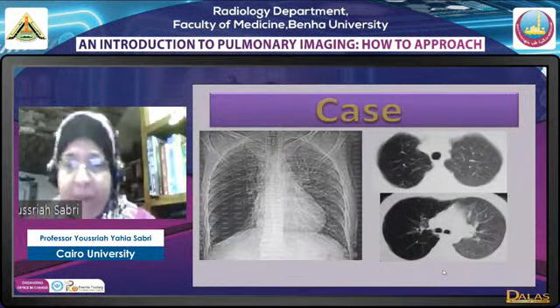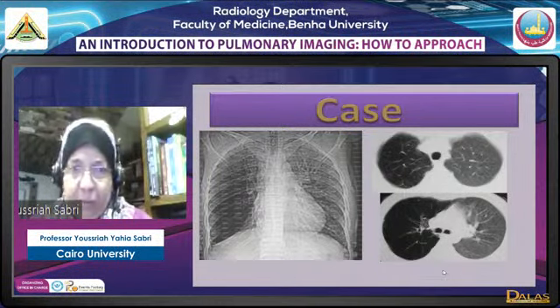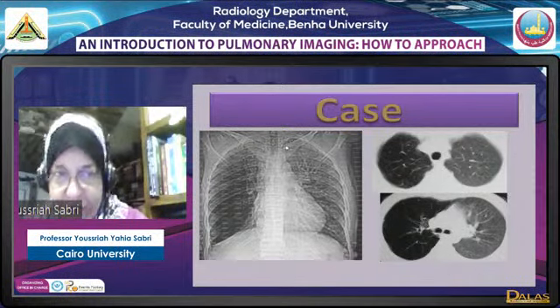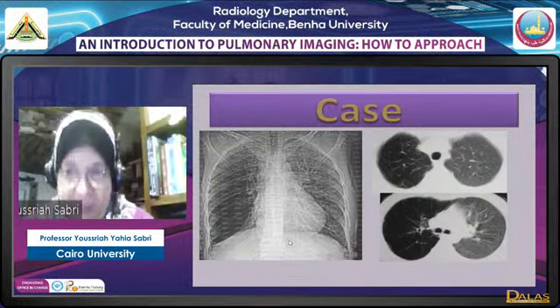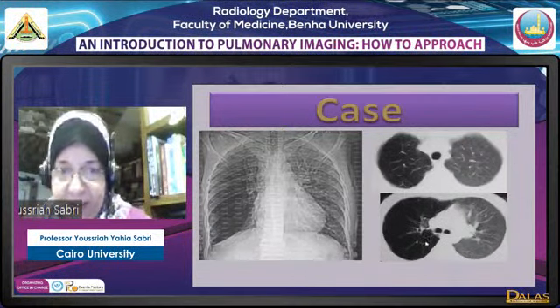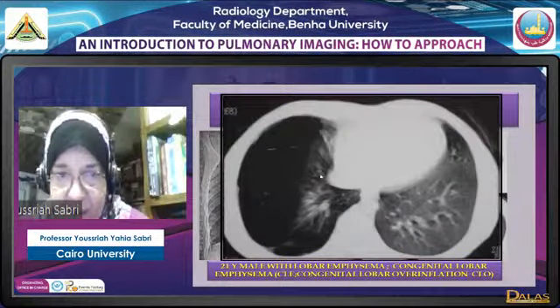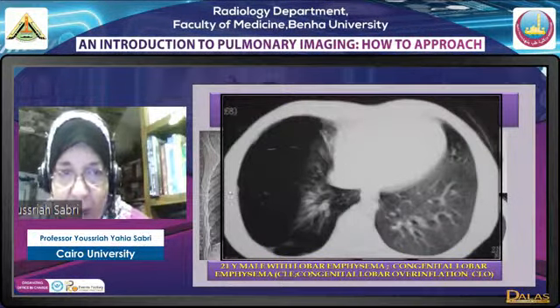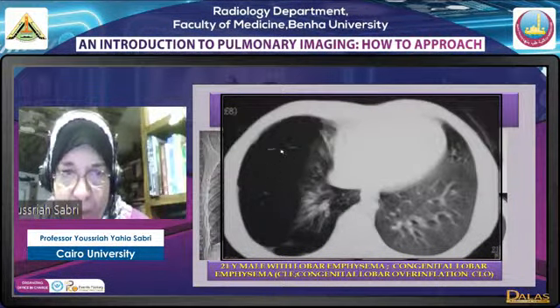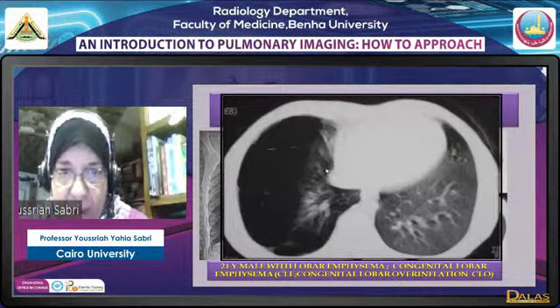Now we know that a big black lung means obstructive emphysema, but we need to understand why there is no shift of the mediastinum. Going to physics, if there is no shift, it may mean that there is something else balancing this mass effect. If we go to the next images, we find that there is still lung tissue here. So is it hyperlucent? This is not pneumothorax. We have lung parenchyma and vessels here, sparse but present, and we have this lung opacity.